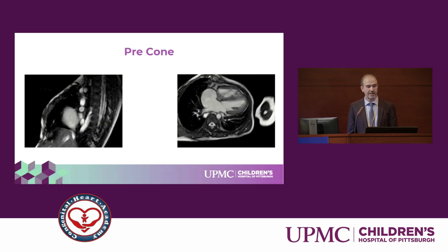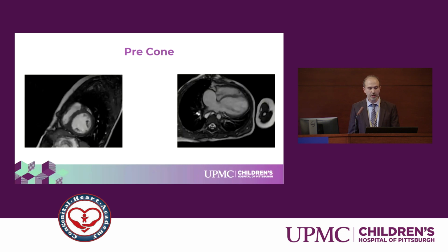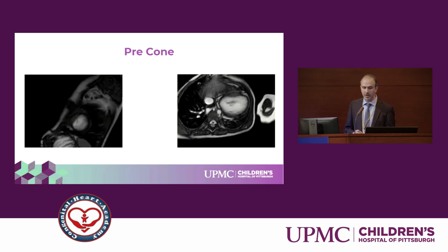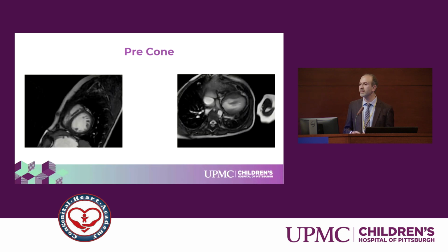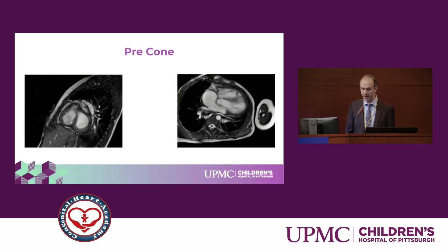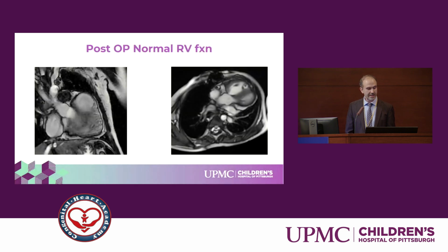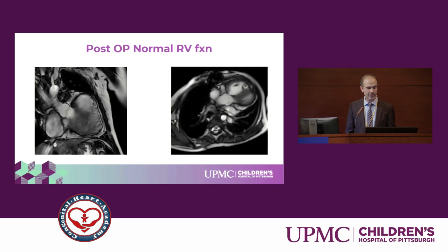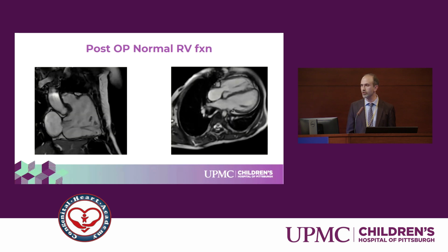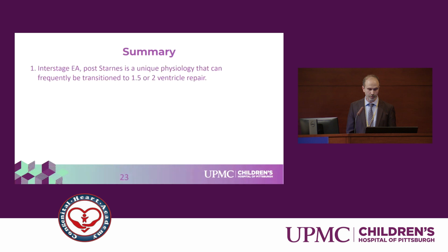This is just to look at her pre-cone cardiac MRI, and what I want to highlight here is that you can see that pre-cone, even with cardiac MRI, the RV is decompressed, and the RV wall motion is severely depressed usually in these Starnes, and that's common. We don't use it for the selection, and you can see in this patient, the RV function nicely normalized after the cone operation with normalization of the RV size as well after that Starnes membrane was removed.